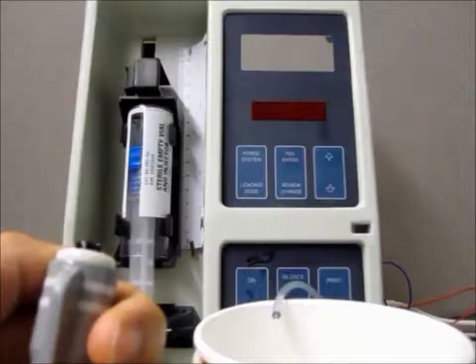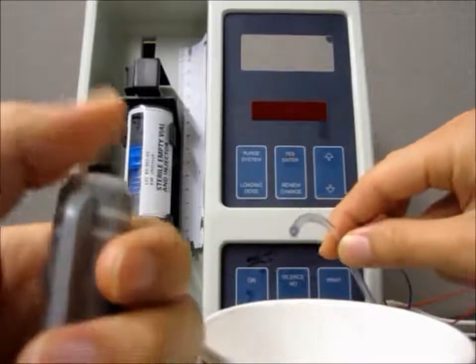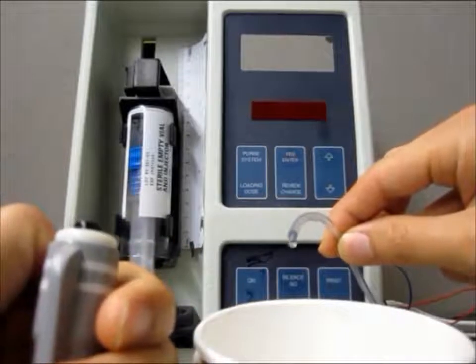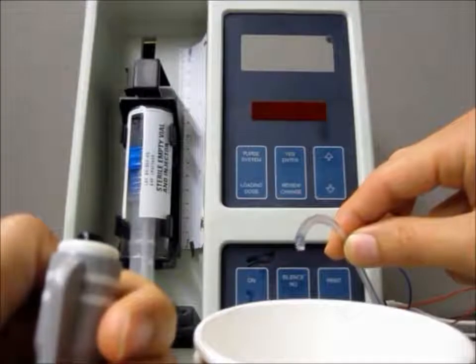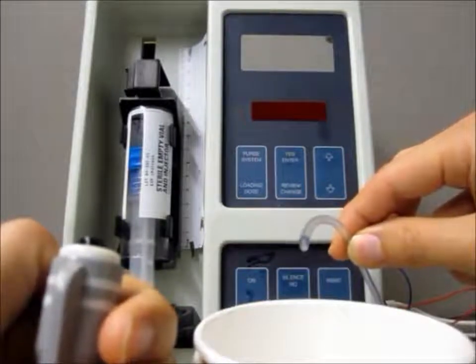Typical PCA infusion pumps have a patient pendant with which patients may request a bolus. When patients request a bolus, PCA pumps administer a certain amount of drug to patients according to their prescription. The speed of administration depends on the bolus rate parameter.